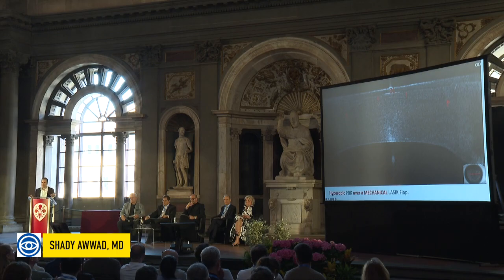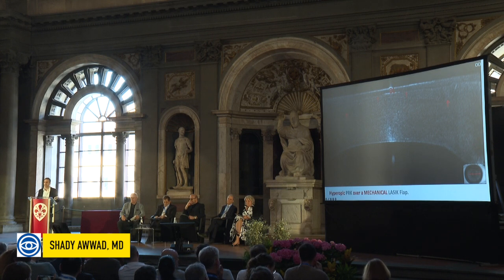So a lot of information that you might miss if you don't stop, look at your OCT, and shift to anamorphic, instead of just taking a look at your tomography. And that's the advantage. And this is always done on the routine scan. In my clinic, every single patient gets an MS39, and then we see them on the slit lamp. So this is like a digital slit lamp. They have it anytime they come in the clinic.